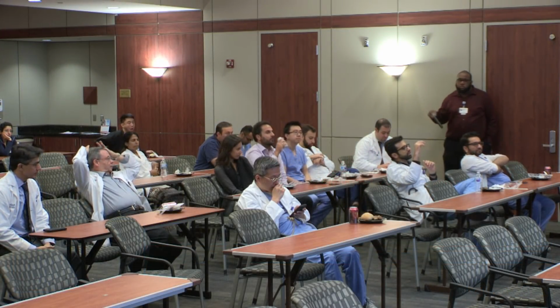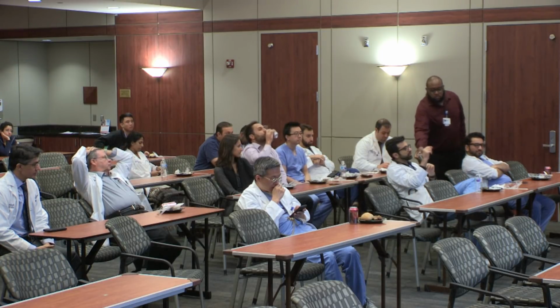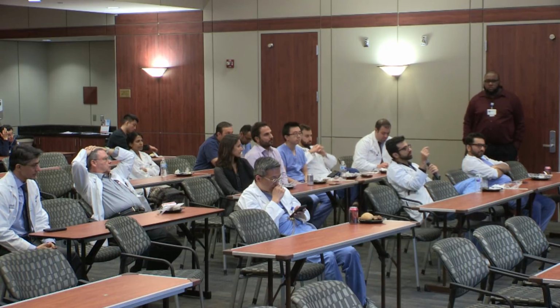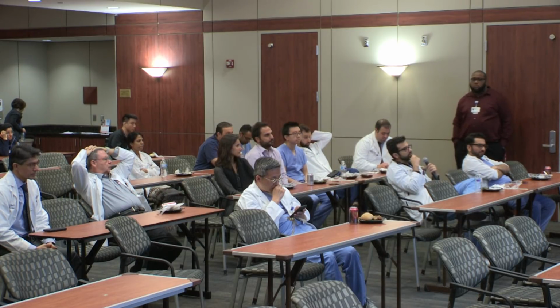Why is it that the atrial reversal duration changes as opposed to the A duration? What does it mean when you take the atrial reversal minus A? Okay.